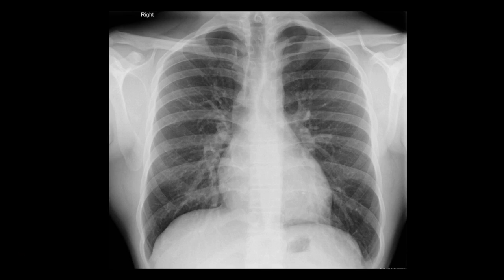So over here, we have a left apical pneumothorax, which is small. So that's the pleural lining of the visceral pleura. And we have a small pneumothorax over here, which I'm going to shade for you. In this part of the lung, you can't see any lung markings. There's a subtle increase of radiolucency. But the rest of the lung, as you can see over here, is nice and well expanded, okay.